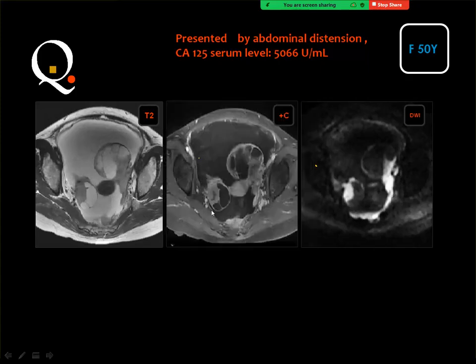And you got two ovarian masses actually, and these ovarian masses are partly cystic and partly solid. Also on the right side, you got a cystic and solid component. This is definitely malignant. And these lesions are, as you know, that serous cystadenocarcinoma is more likely to be bilateral compared to the mucinous cystadenocarcinoma, and the incidence of serous is much more, maybe 10 times more common than the mucinous cystadenocarcinoma.